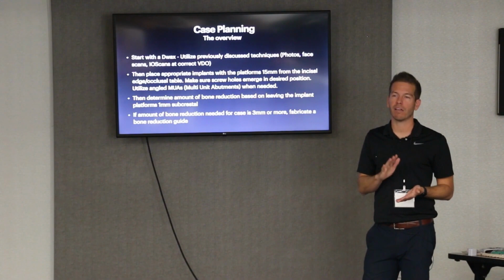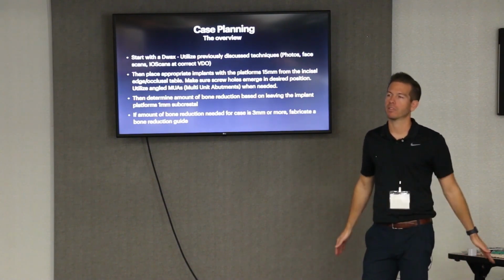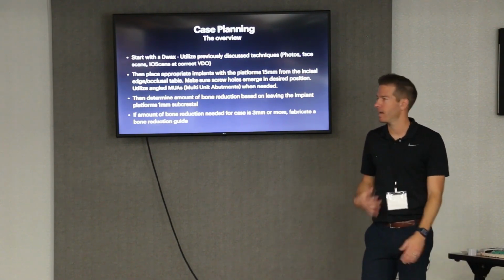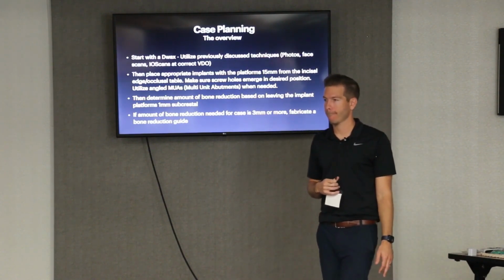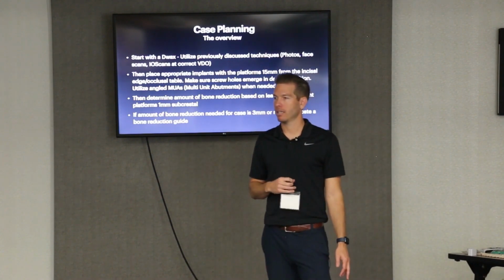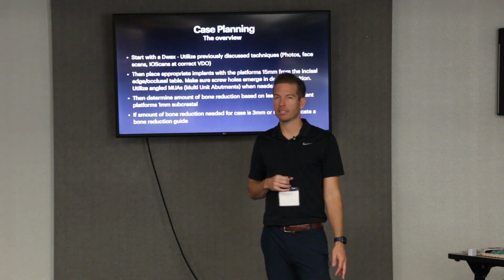All right, anybody have any questions about the wax ups? Anybody stuck with any digital wax ups and stuff? I know we kind of did that a little bit last time. Any questions on that? When you have like a full arch or a half an arch, you'll just go to the denture module and pull the whole thing over. Yep. I'll start with a whole chunk of them. Yep. At one time. Yep. Exactly. Crown and bridge. Yes.